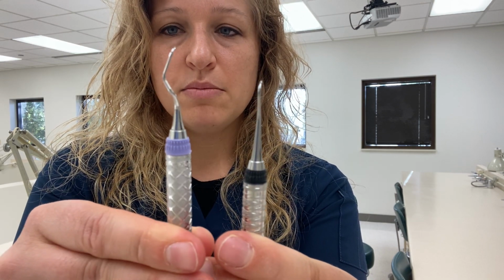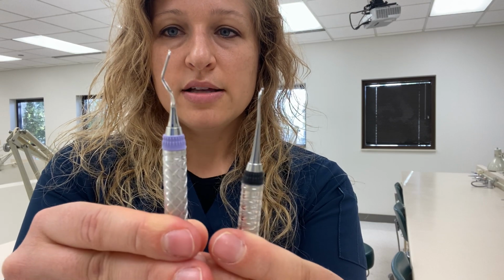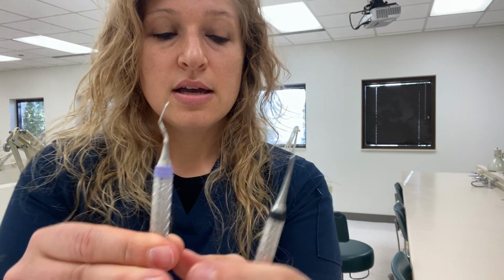It is bent in more than one plane. So when you look at this, it's made to get around big parts of teeth and to fit into places. You would think that it would potentially go to the posterior, or toward the back of the mouth, so that it can fit around some of those areas where the simple one could not.